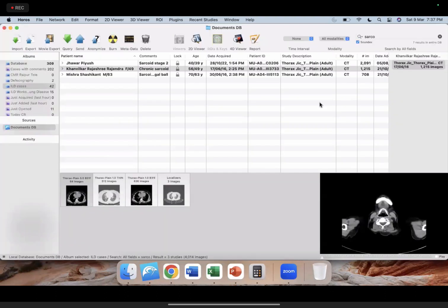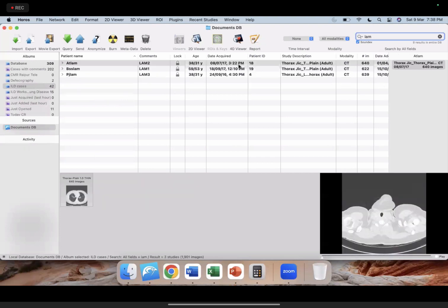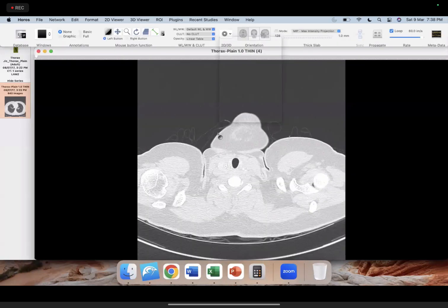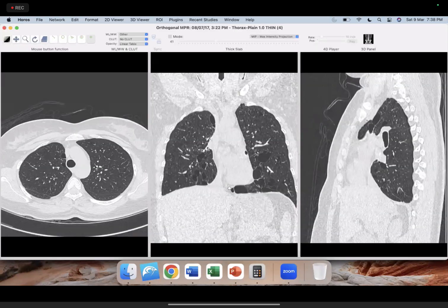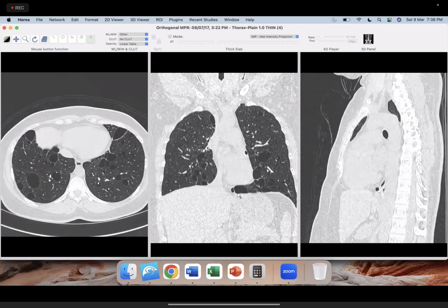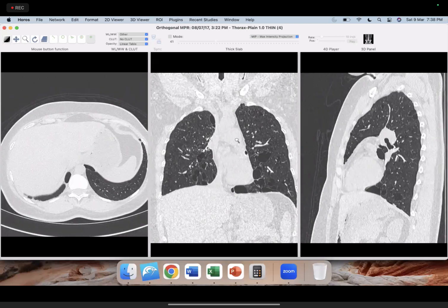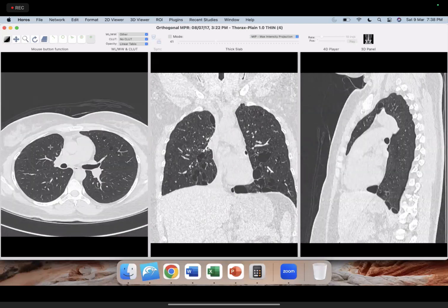Okay, so now we can move to some of the other cases quickly. I think we have time, so we can just quickly look at this type of cases also. Again, now we are switching to non-fibrosing ILDs. Right. So I'll go a little quicker because here we don't have too many signs. We have just one finding to be looked at. So do you see any sign of fibrosing ILD: reticular opacity, honeycombing, traction bronchiectasis, or architectural distortion? Again, the answer is no. Please don't get confused with some of this post-infectious inflammatory fibrosis.